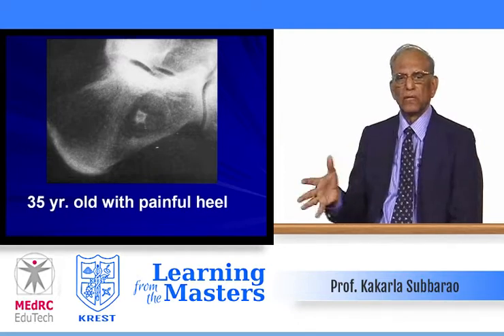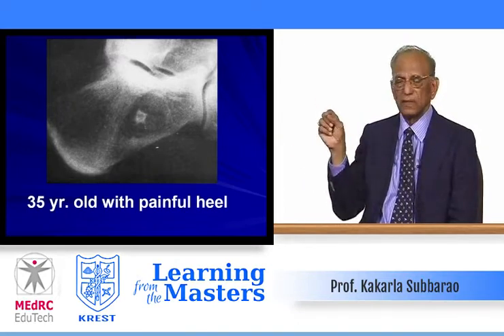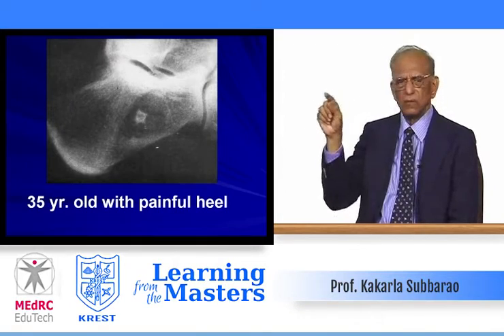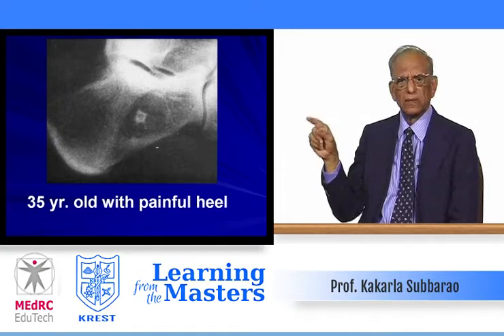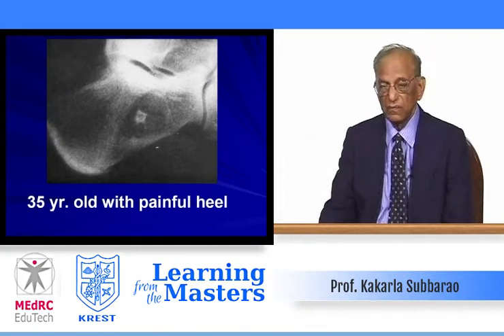35-year-old with a painful heel. What do you see? Large, again a lucent area with central calcific density. A lucent area with clear-cut margins. Transition zone is clear-cut, telling that it must be benign. Make a diagnosis.